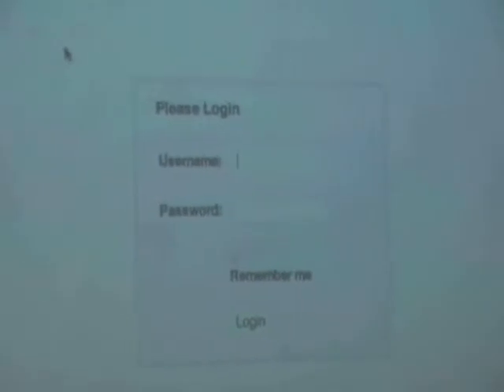And here we have the caregiver interface made by Pavia. So here the caregiver should log in, so in this case John Smith, and enters the interface. So there we have a button, enroll new patient. This could be like a hospital ID. So we take some very big ID. And then when I press the button, it will enroll. But let's first do something else.